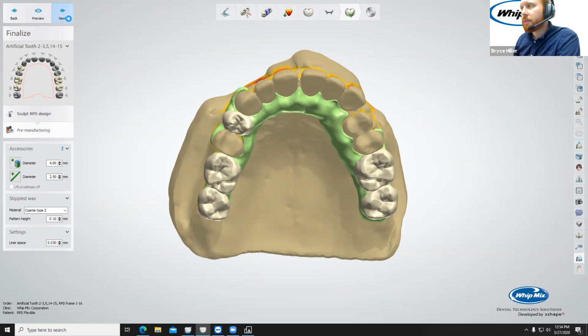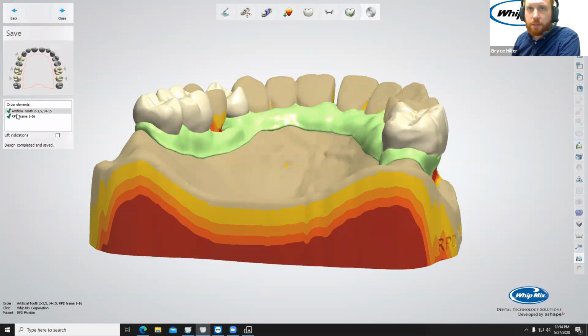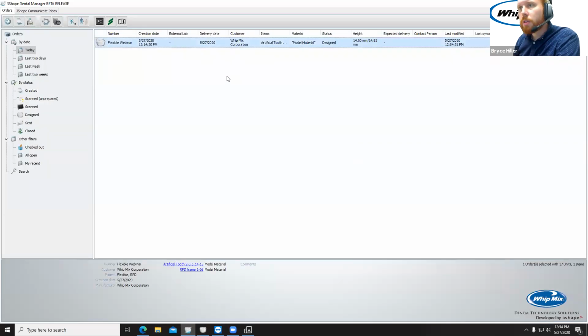Let's click next. I want to output these files so everybody can see what they look like. So now we're saving all of our files. We've got green check marks, which means everything's saved properly. I'm going to go ahead and click close. I'm going to export those by pushing F7 on my keyboard. Then I'm going to open that directory by holding Shift and pressing F4.